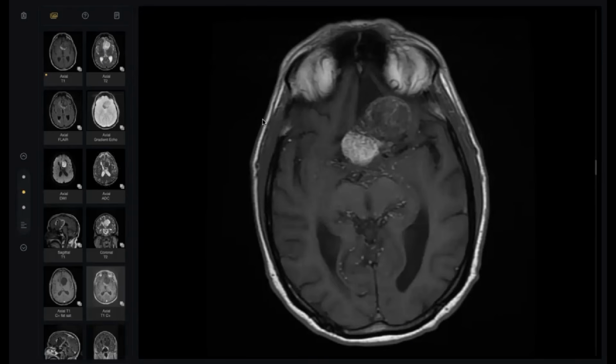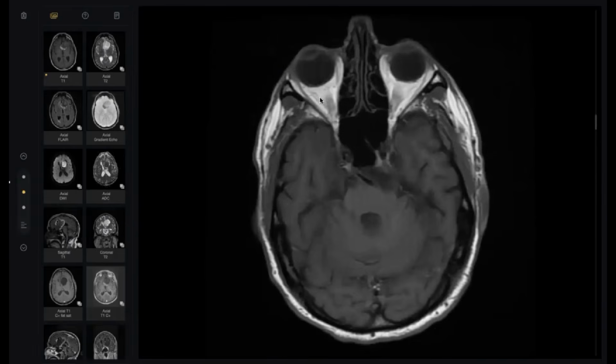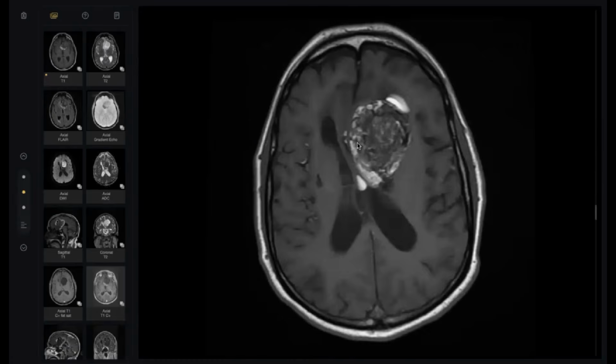What else? See, what is this? Optic nerve glioma, first or second? What is this? Fat stranding around the... Fat. What is it? The signal of fat. Does the signal look like this one or not? Yes. What do you think?